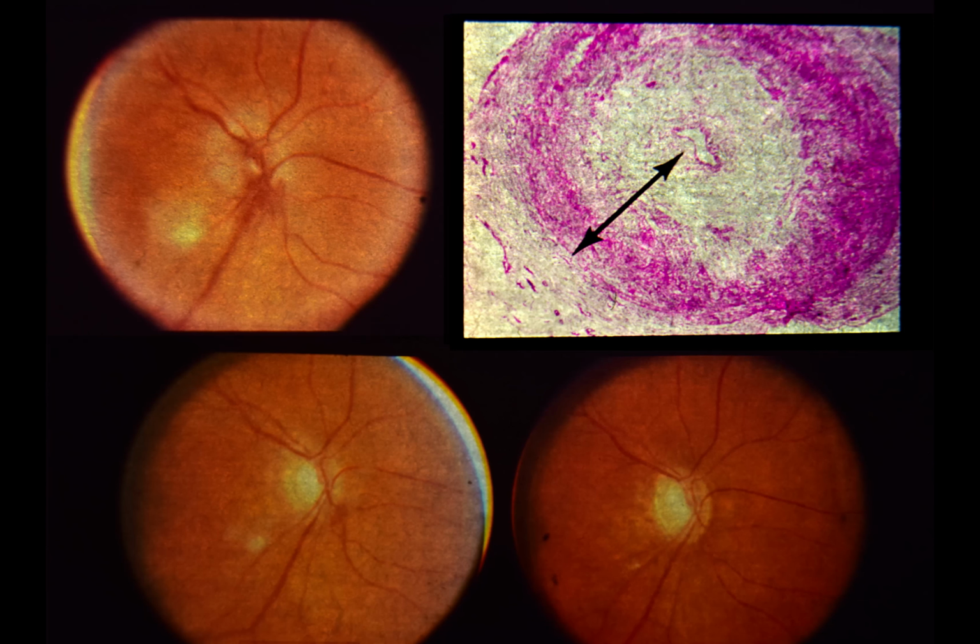Upper left. The right optic disc is elevated and edematous. Superficial hemorrhages are present inferiorly, and a large cotton wool spot is seen along the inferior temporal artery. The retinal veins are slightly dilated. An erythrocyte sedimentation rate was 60. The patient was started immediately on 80 milligrams of prednisone daily, and a right temporal artery biopsy was performed.